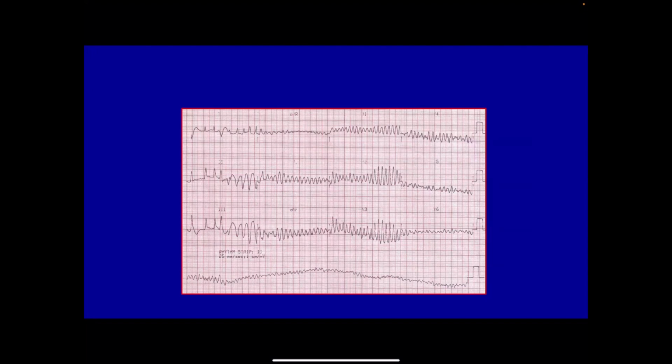Ventricular fib. VFib? Yes, ventricular fibrillation. Why? Because you cannot see the QRS here. I mean, it's moving. Okay, I understand why this can confuse. I completely agree, but there's a specific pattern here.